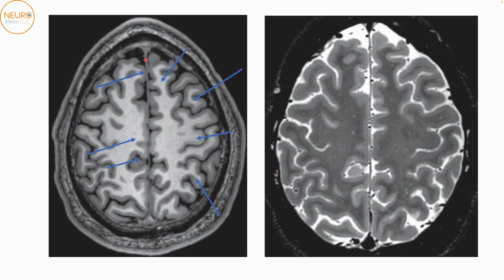In the next cut, we're able to still see the superior sagittal sinus. You've still got the falx over here. This continues to be the superior frontal gyrus. This is the middle frontal gyrus. This is what is known as the omega sign. This omega sign corresponds to the hand motor region on the motor cortex. So this is a very easily identifiable sign on both sides. This is also the omega sign on the other side, and this on this side.